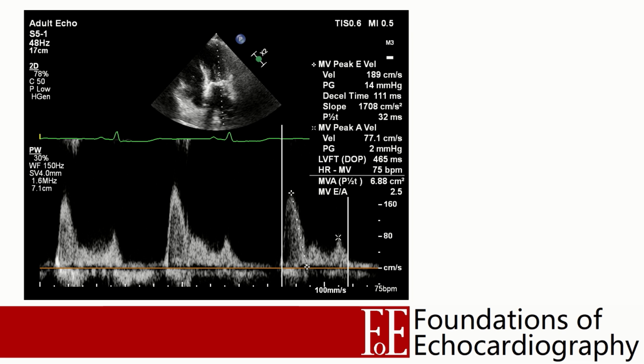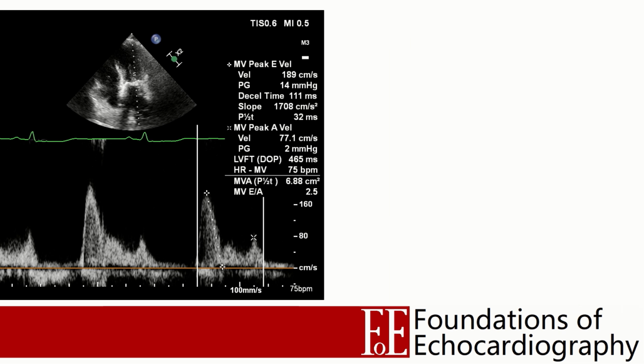In addition, this hypertrophied LV will have low compliance, so when the atrium contracts in atrial systole, it struggles to push much more blood forward. That patients with elevated left atrial pressure can have LV filling traces which mimic healthy individuals can sometimes prove a challenge to accurate interpretation of the measurements that we make.